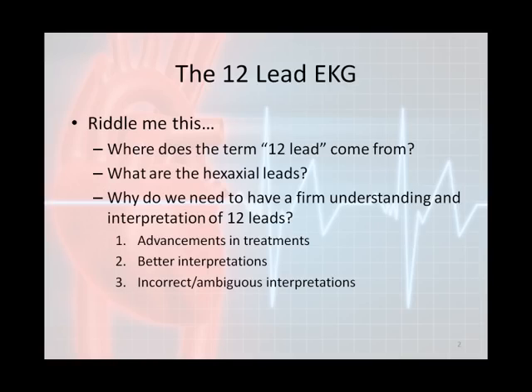If you trust the interpretation on the EKG only, and you don't know what the computer is looking for or even looking at, then how are you supposed to treat this patient with such an ambiguous statement? If this is the case, then you will have to treat every single patient as if he or she is having a heart attack because the interpretation said that you have to consider ischemia.